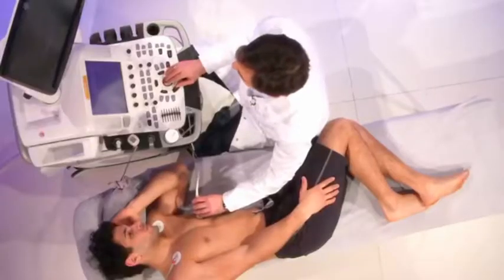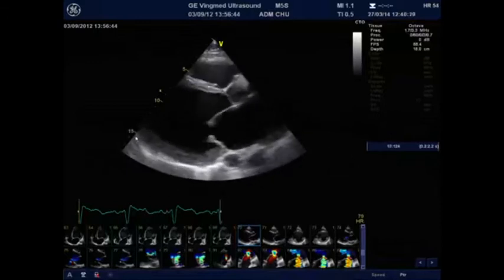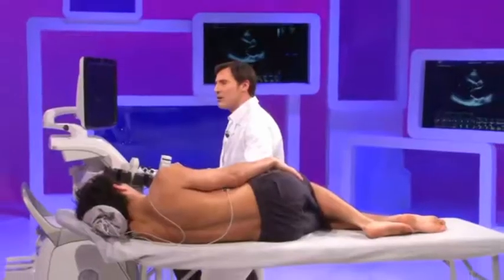three different steps. First, you look at the valve, and let me take again the parasternal long axis view, where here you have the morphology of the valve that is completely deformed due to the attraction by the papillary muscles that are displaced and distorted due to the left ventricular dilatation. And again, this kind of mitral regurg relates to two different things: an increase in tethering force and a decrease in mitral closing force.